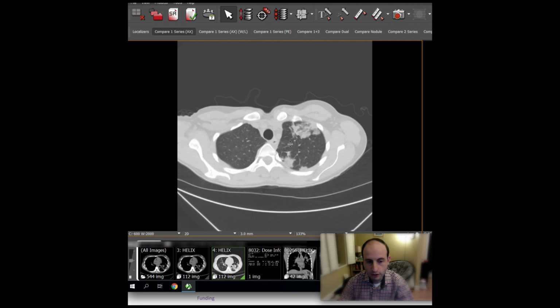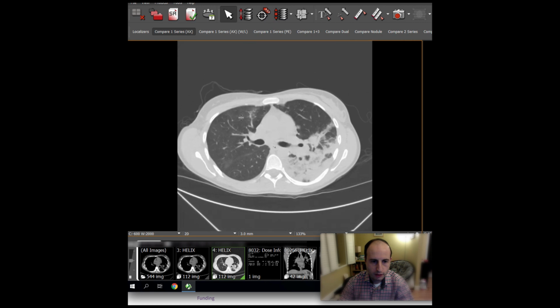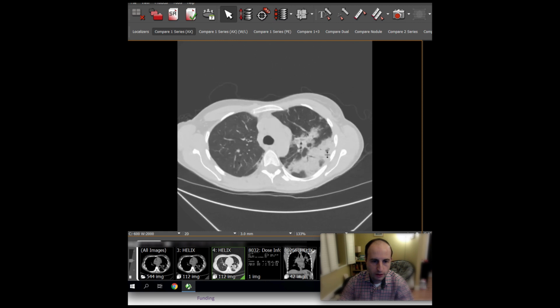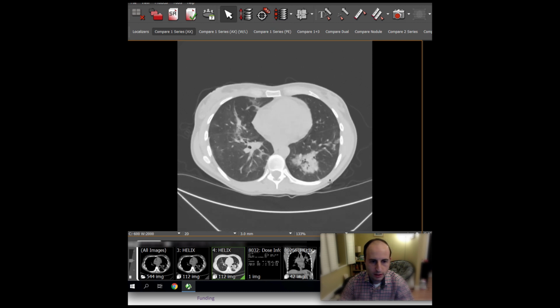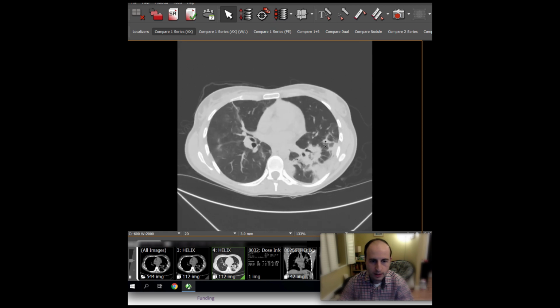Patient with consolidation, patchy but quite extensive, asymmetrically involving the left lung greater than the right. Some areas are central, but predominantly peripheral consolidations. There are areas of central clearing here. Notice that this consolidation spans the major fissure. This patient had peripheral eosinophilia, and this is chronic eosinophilic pneumonia.